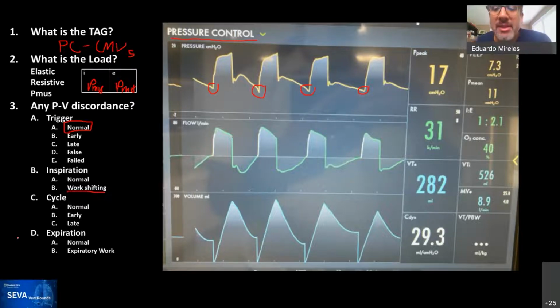Anybody? Is the patient getting the exhaled or the inhaled tidal volume? You have to assume inhaled. Right. So that's the air that got delivered, that the flow sensor sensed it delivered to the patient, correct? And then the exhaled is the same thing: what the patient is exhaling and it's coming out of the ventilator.